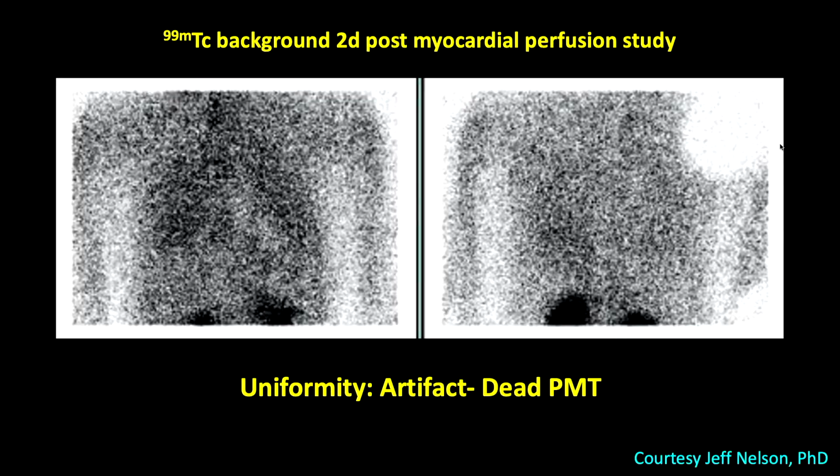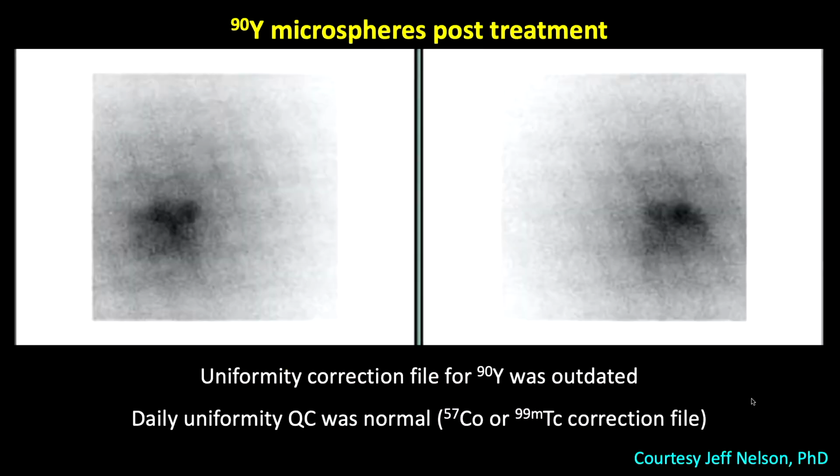Now in this case, it's obvious. But if you were doing a liver scan or something, you saw this thing, you might think it's a cyst or something. So, the key is that it's going to show up on every image, right? And also it kind of has an unusual appearance and localization. So this is one of the uniformity artifacts that you would pick up if you had looked on the uniformity study.